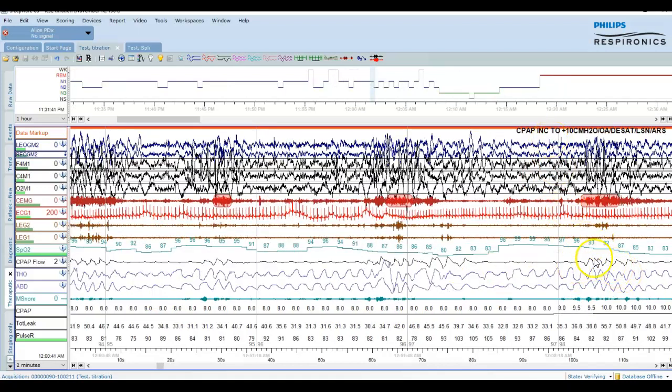Now, around the 12th minute, the CPAP is increased to 10 cm for obstructive apneas and desaturation. So now you can see here the CPAP pressure is increasing to 10 cm. Here the technician used 2 centimeters for every increment. But if you are a newbie, I would suggest you start the increment at CPAP 1 centimeter.